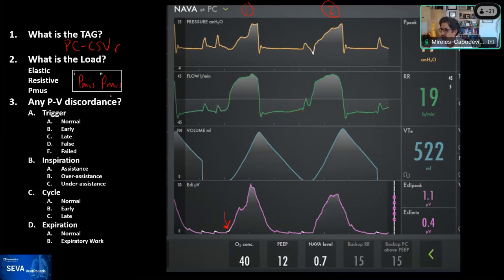Yeah, so I see some support for Fernando, and I would highlight a couple of items here. You have several items, and I'm going to highlight these little things over here, and you can see that there's a change in color, which tells that something triggered.